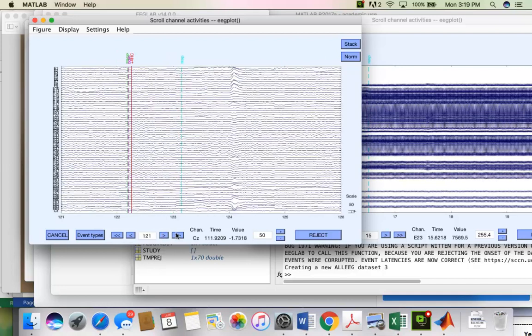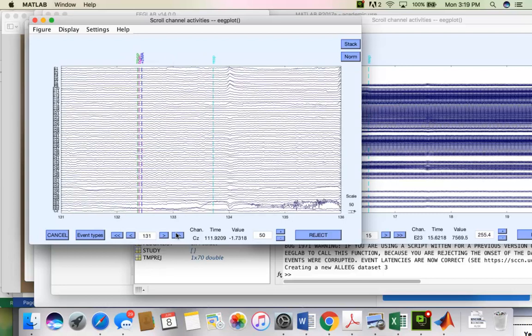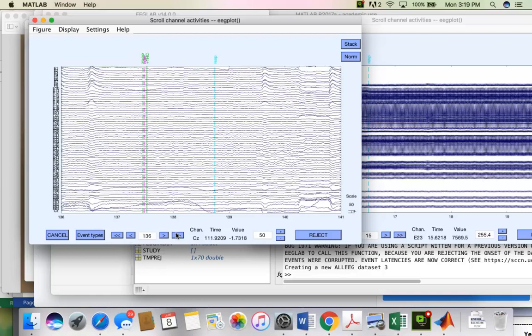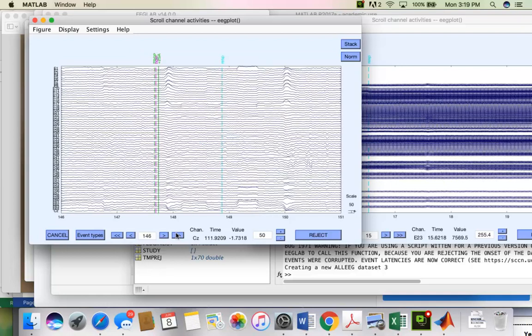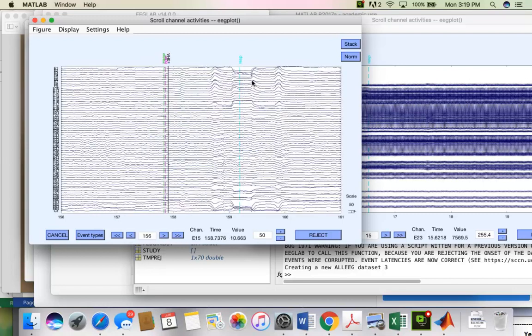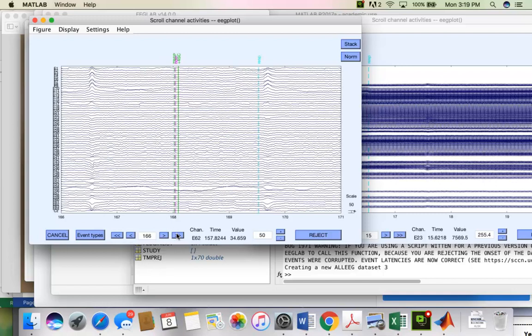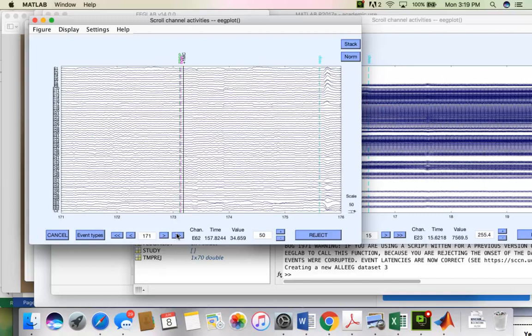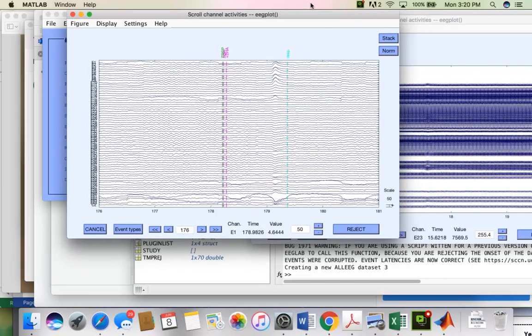You can see in subject number 6, which is what this data was, that so far we found, spread across all the channels, maybe 2 places where we have some really bad data. Even this is not too bad. Those are eye movements. You don't see huge amplitude swings or anything like that. So overall, this data is pretty clean. I can tell you that subject 1, the data do not look nearly this pretty.